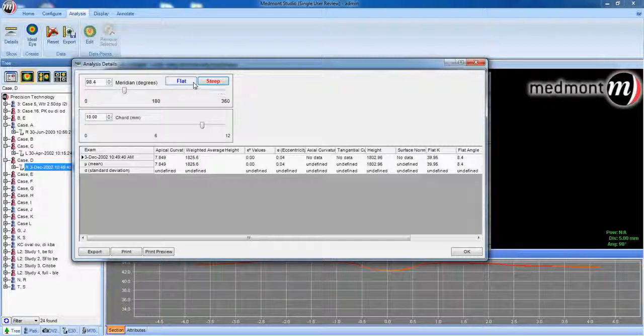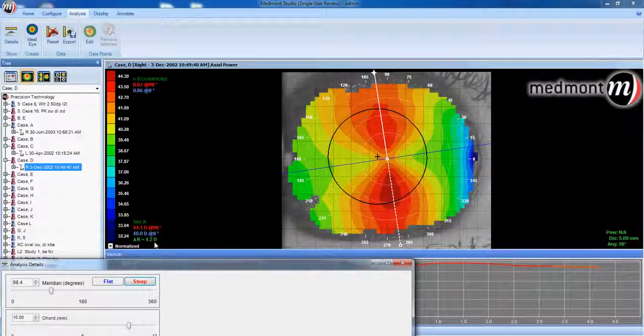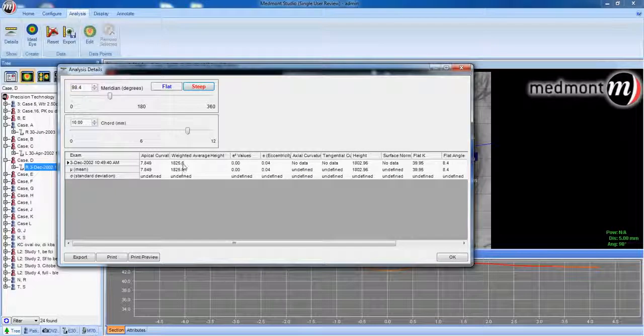When fitting contact lenses, this would be profound in trying to fit this limbus to limbus 4.2 diopter corneal astigmatism with a spherical GP lens. Clearly a toric would be required, both because the corneal astigmatism is high, but also because it's limbus to limbus corneal cylinder, and because you have a very high differential between the flat meridian and the steep meridian in depth of eye.